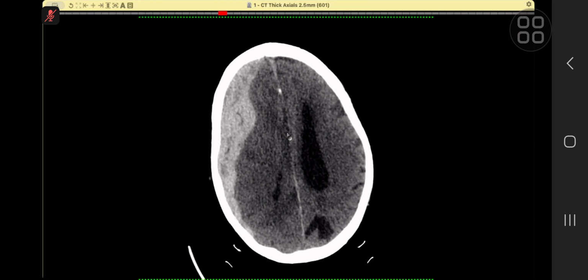The case which I am showing you, I was just doing an experiment on Osirix, and it is a very, very subtle case. On our PACS with high resolution, it is more convincing. So I'll show you on Osirix. The resolution might not be as good, so I've made a PowerPoint also of screenshots just to highlight what was missed.